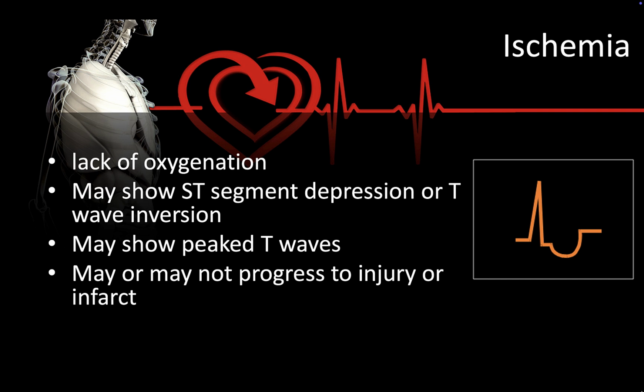Sometimes ischemia is simply that. It may be a case of angina or something else that's causing some ischemia that's only temporary, but it may be an indication of early signs of an infarct.